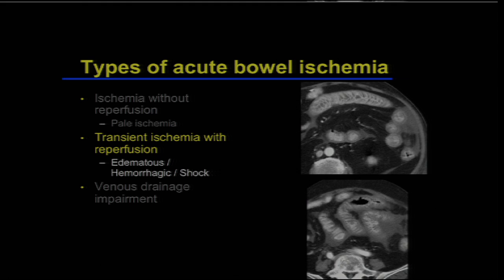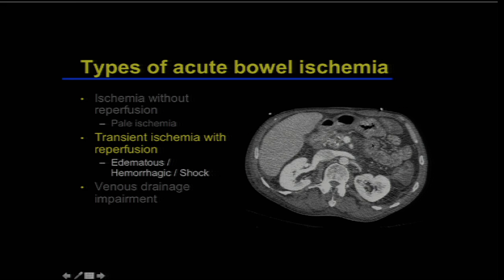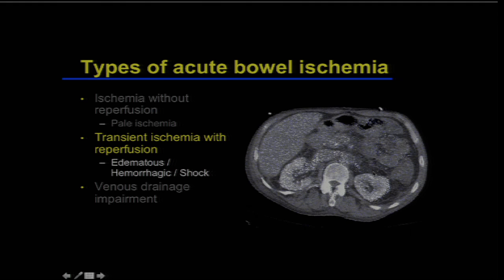So we all know this appearance of bowel where we see extreme hyperenhancement of the mucosa. That means the patient at some point in the recent past, in the last several days, dropped the blood pressure very low and needed fluid resuscitation, and then the mucosa becomes hyperemic. Here's another example, a patient with a cardiac cath. We can see some retained contrast in the kidneys, and we can see the shock bowel appearance, the hyperenhancement of the mucosa, really finely etched, bright plicae conniventes of the small bowel.